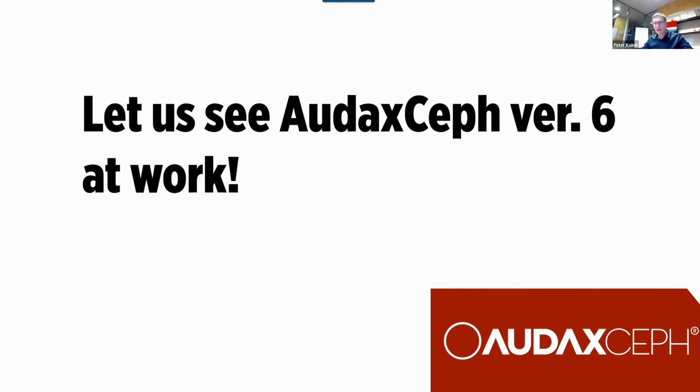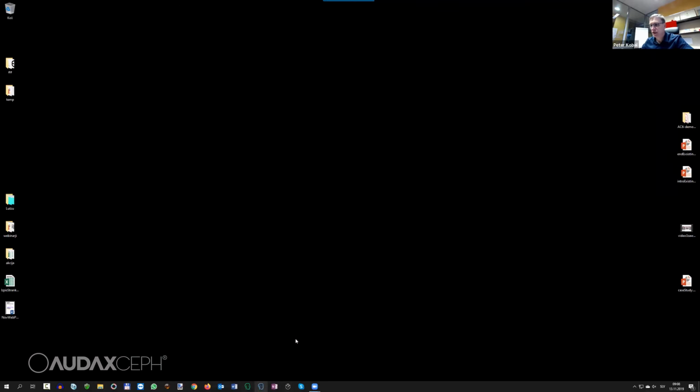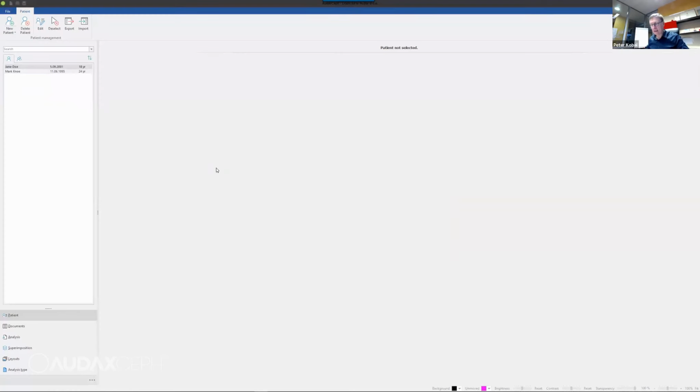Hello everybody. I'm going to shut down the PowerPoint now, and I will start AudaxCeph version 6. We did quite a lot of new functionalities in this version, and one thing is that it's faster than the previous versions. We really put a lot of effort into that, so it's 60% faster at startup. It's much faster at placing images and so on. I'm going to show you that during the webinar.